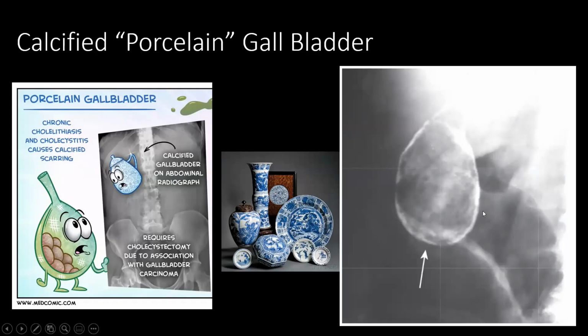So this porcelain calcified gallbladder indicates that this gallbladder was inflamed and irritated multiple times. So when I have multiple bouts of cholecystitis, which is an inflammation of the gallbladder, when I excise it intra-op, I will see it in this color, and when I look at it on X-ray, I will see this rim of calcification.